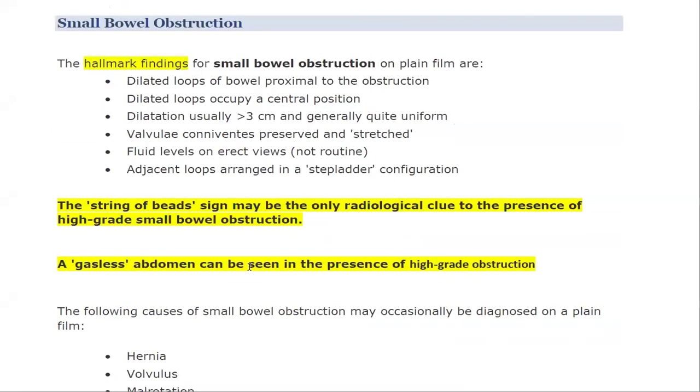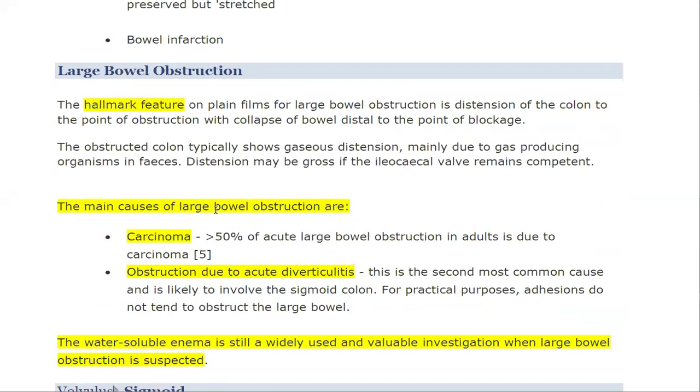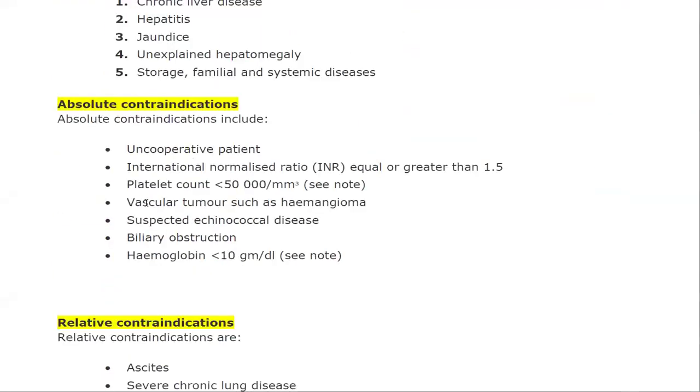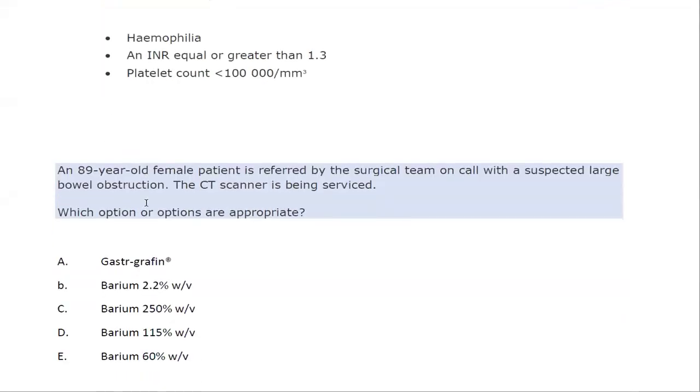Okay, let us go quickly through this. This is not the next step, this is the criteria of the disease in X-ray. So now we are with the questions.